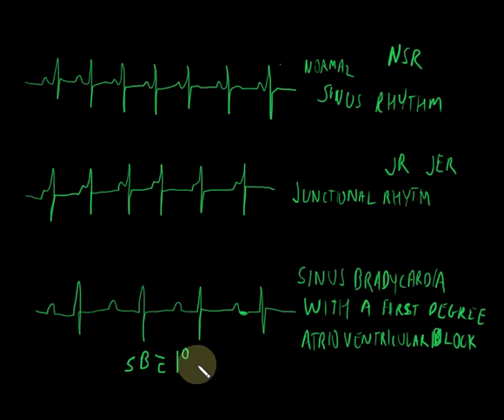For the purposes of our testing, I'm okay if you just call it a first degree block. That's fine. What you will find is the sinus brady, though, is helpful because it tells you what the rate is. And we're going to discuss management before too long here. And as I talk about management with you, I want to explain when do we need to treat somebody. If they have a sinus rhythm with a first degree AV block, I don't care. As a paramedic, that's not an emergent concern. Honestly, if they have a sinus bradycardia, a rate of 40 here, I'm concerned about the fact that their heart rate's down to 40. So I'm going to do some things in my management to try and help increase that heart rate and improve their cardiac output. But I'm not real worried about them unless they're having symptoms. And most of the time it's the symptoms that I'm worried about. But I can give them something to help increase the heart rate. If it's slightly tachycardic, that rate of 100 to 150, I really don't need to do anything about it at all. So there's all different kinds of things that can crank somebody's heart rate up a bit.